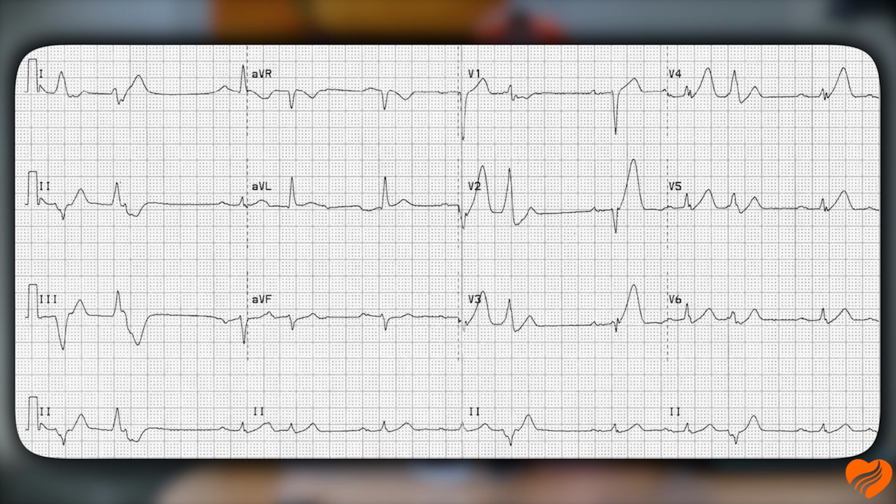Rolling right into this education, I'm going to go ahead and present a quick case study and 12-lead for you. 12-lead should pop up on your screen now. Let's consider this case study. You're dispatched to a 55-year-old male, chest pain radiating to the left shoulder. You arrive, ground ambulance provides you with this 12-lead. Go ahead and take a moment. We're going to assess that 12-lead as you would in real world. Go ahead and think about your considerations, what might or might not meet STEMI criteria, what looks odd or weird to you. And then go ahead and consider what your treatments or treatment course might be while you have this patient for the next, anywhere from 10 minutes to the next hour.